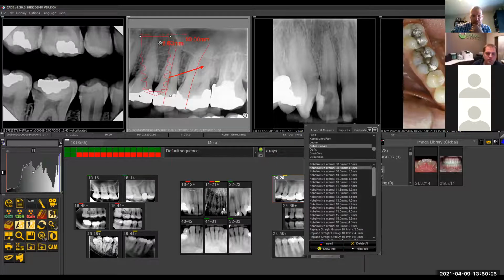And then when you did that, you can move it, you could rotate it. Grab the corner. You can rotate it around, put it in the right angulation, and know, based on this, what size of an implant you're going to need to place in terms of the abutments and depth to the nerve and stuff like that. And that's where you also have that measurement.